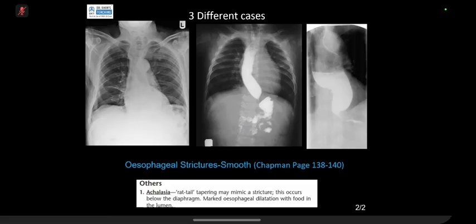In radiology, this is a favorite in the exam because they show you a chest X-ray to pick it up, right? And then you can ask for a barium, and this is what you are going to get, a dilated esophagus with a stricture. This appearance, if you stretch your imagination, is known as rat tail stricture. Rat tail stricture, right? Oh, okay, bird beak is absolutely fine.